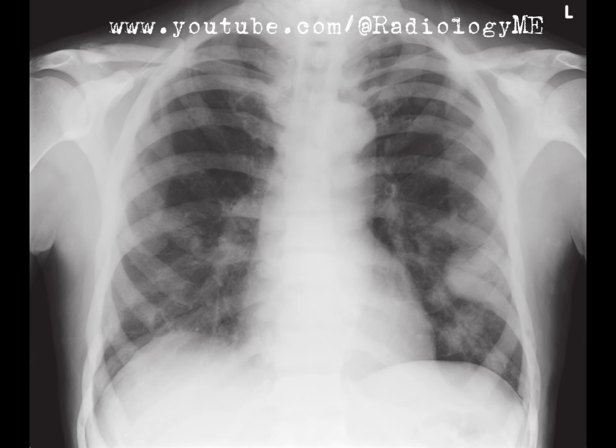Finally, I'd expect them to ask, what further investigations would you suggest? My answer would be to recommend a bone scan to confirm widespread osteoblastic metastases and a CT scan to further characterize the pulmonary nodules and look for other sites of metastasis. Clinical correlation with PSA levels or breast cancer markers would also be useful in narrowing down the primary source.